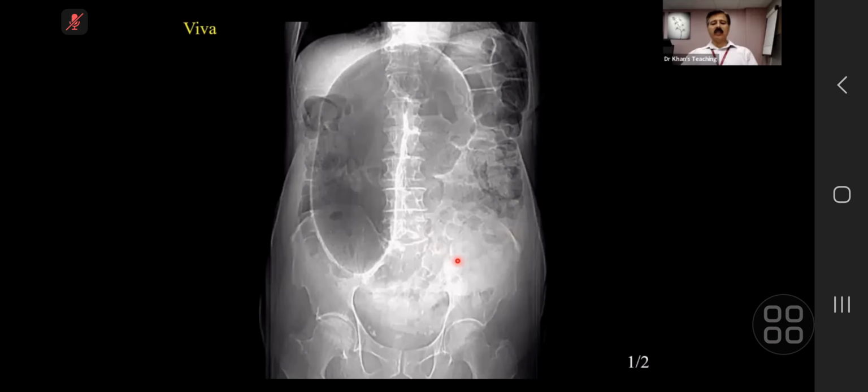Excellent, excellent, well done. Conclusion. So as this patient has got a volvulus, I would relay the findings to the clinical team. Which kind of volvulus? I'm trying to hear which part of bowel you are talking about. Sigmoid volvulus. Excellent. Okay, well done. I'll take over.